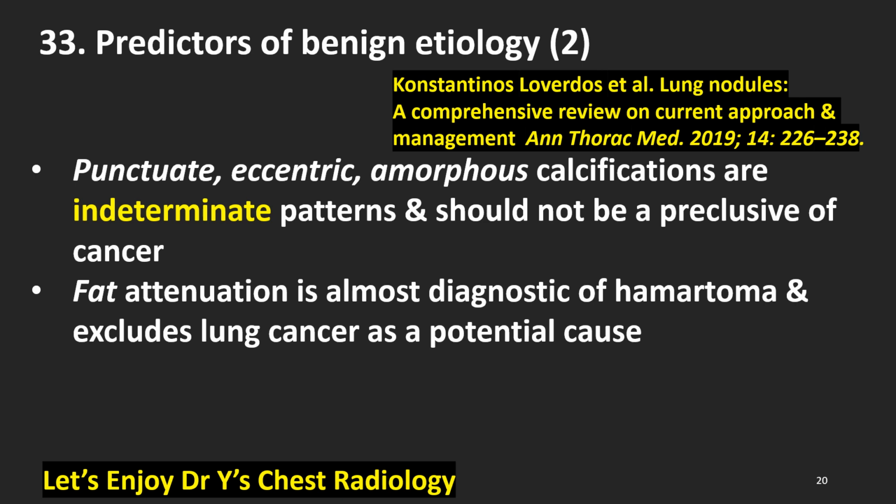Predictors of benign etiology, number 2. Punctate, eccentric, amorphous calcifications are indeterminate patterns and should not preclude lung cancer. Fat attenuation is almost diagnostic of hamartoma and excludes lung cancer as a potential cause.